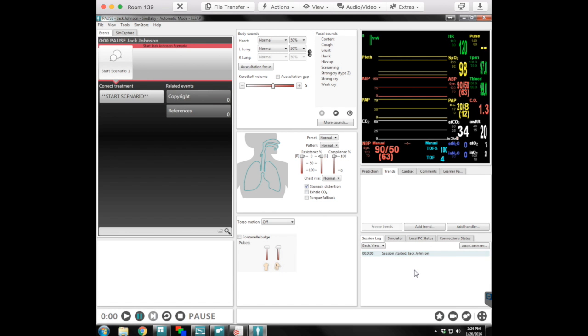Great, we have that particular software loaded up. A couple more things that we need to make sure that we do. Most of this stuff will already be done for you. When you come in to do scenario as a clinical instructor, this software will be up and running, the rooms will be ready, the mannequins will be ready, along with all of the resources that you need. So really when you sit down, you're just going to be running a checklist for the most part. There'll be very little of starting these applications up, but I did want to show it to you just in case you were interested. A couple more things I've got to do.